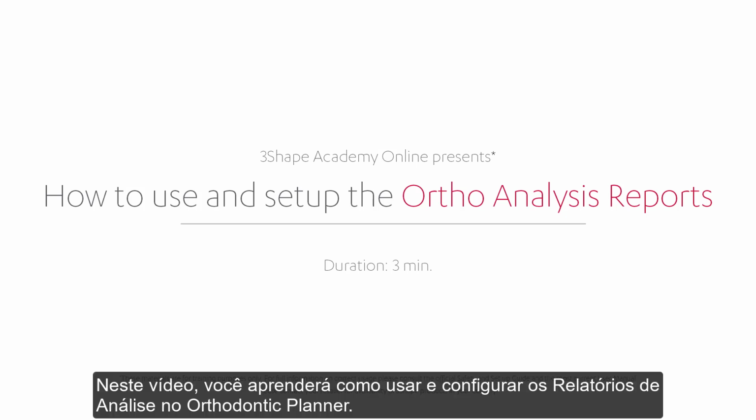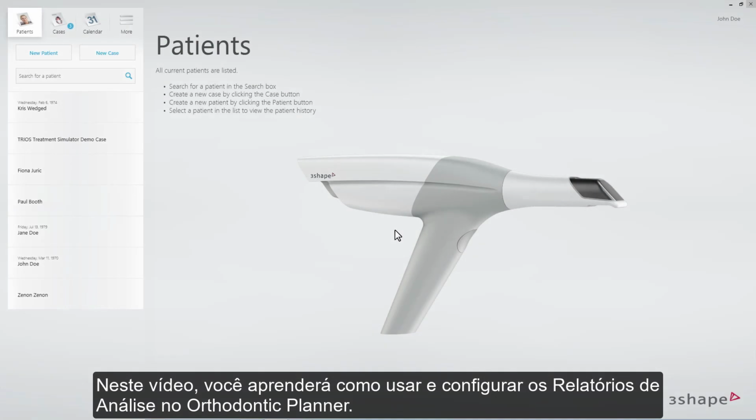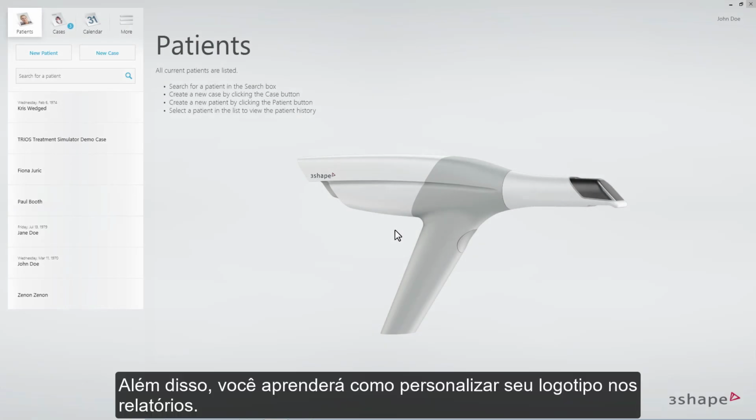In this video you will learn how to use and set up analysis reports in Orthodontic Planner. Also, you will learn how to customize your logo in the reports.